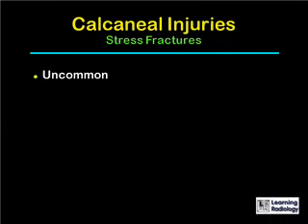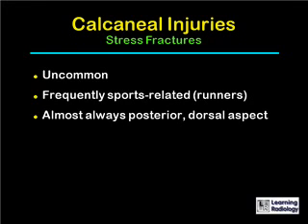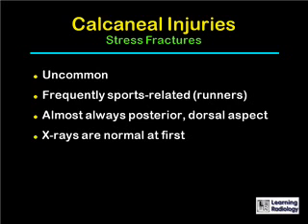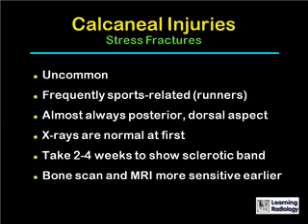Stress fractures of the calcaneus are uncommon. They frequently are sports-related, as in runners or in military individuals. They almost always are posterior and along the dorsal aspect of the calcaneus. X-rays will be normal at first and may take from 2 to 4 weeks before they show a classical sclerotic band in this location. A bone scan and an MRI, as with stress fractures of the metatarsals, will be positive earlier and is more sensitive.